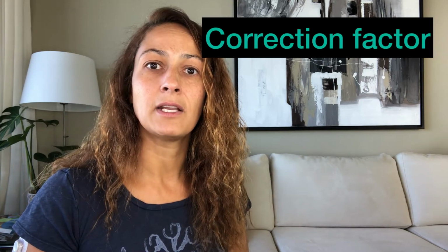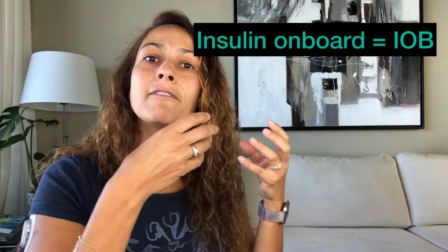What the RapidCalc app can do is act as a bolus calculator. It is a calculator that can help you calculate how many units of insulin to take for a meal, or again, for correction. And what it does is it takes into consideration your carb ratio, so how many units of insulin you need per grams of carb, your correction factor, meaning how much 1 unit of insulin will lower your blood sugars. It will also take into consideration whether or not you have any insulin on board, IOB.